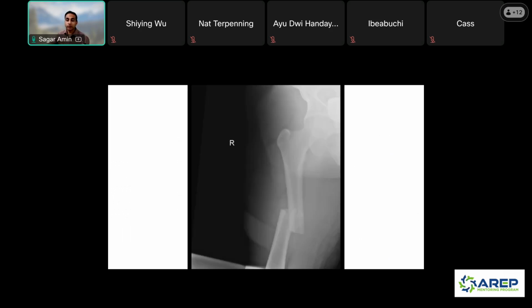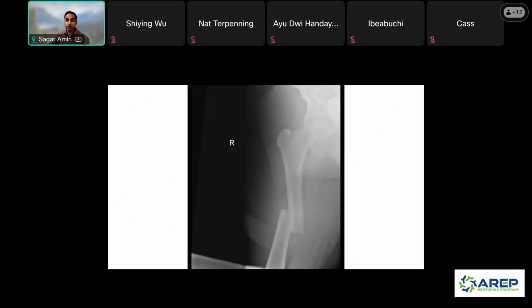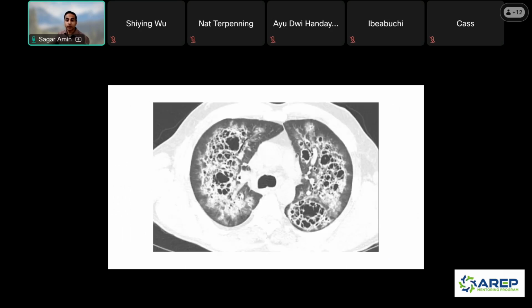So this patient had the more common long bone fracture. So post-trauma, we have a lot of trauma come into our Grady Hospital. And so after a few days from this long bone fracture, they developed shortness of breath. They got a PE study, and then we found this, which was concerning for fat emboli. So something to keep in mind. It's not uncommon, but I think it's something that people easily will look over, especially in trauma patients.